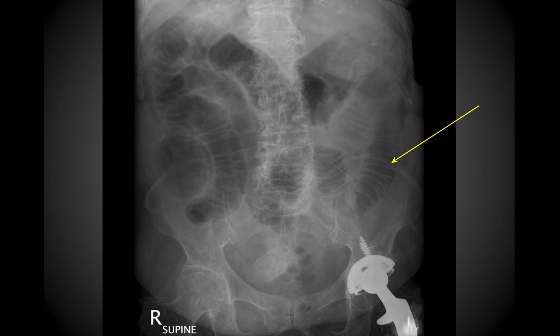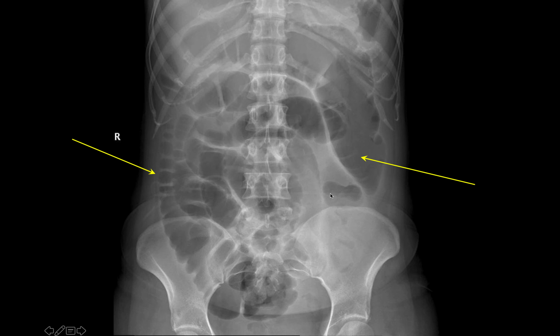Here this is kind of a review of what we've gone over previously in the abdominal cavity. Obviously in this patient you can see that they have a hip replacement. This is not an external fixation device, but you can see the acetabular cup that's been placed. You can see the screws that are keeping that in place. And then this is the replacement head and neck of the femur, and that's stuck right into the femur bone in this patient. So that's a hip replacement. And then you can see the plica circularis very clearly in this patient, so you're looking at lots of small intestine as well.